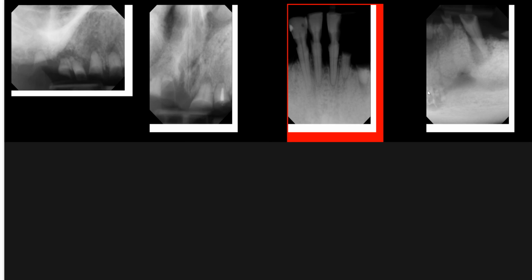Now let's go over here. Obviously, again, incisors with severe decay and retained root tips. As I adjust the contrast, I hope you can see that there are multiple radiolucent channels or lines that extend in the superior-inferior direction, and these represent nutrient canals. Okay. Now, looking at this radiograph, again, multiple retained root tips here as well with large periapical radiolucencies.